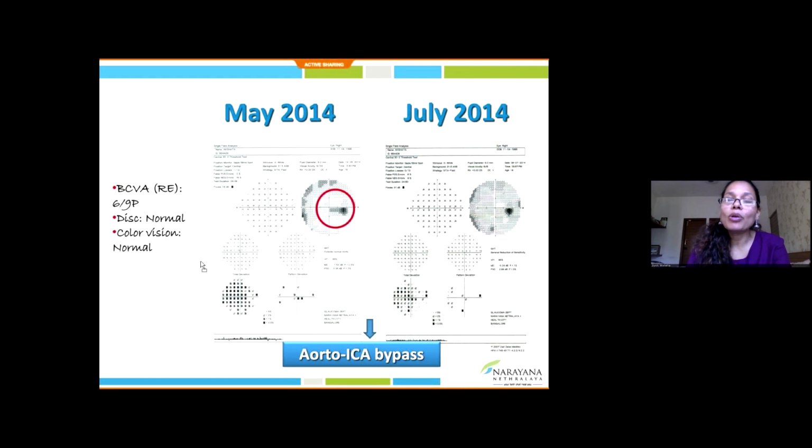But what I wanted to highlight here is that the patient is saying there's a problem. All you can pick up is only a mild change or decreased vision. Please do a field test, because that will at least tell you where the problem is, which you can see reverting back because it was in the initial stages. Let's look at case 3.